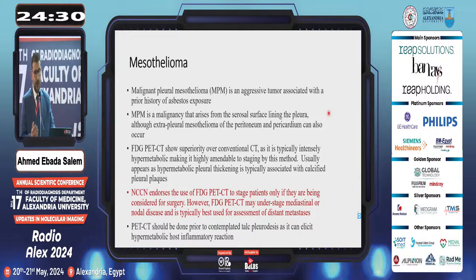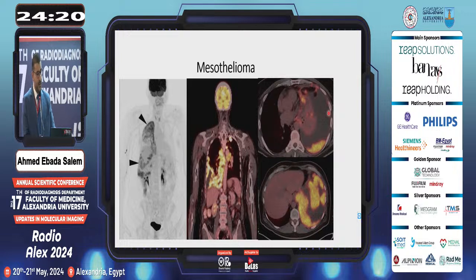Because, as Dr. Morton was talking, talc pleurodesis is associated with a strong inflammatory response after application. So those are different cases. This is a MIP image of PET-CT, and you can see there is diffuse increased activity localizing to the entire hemithorax.